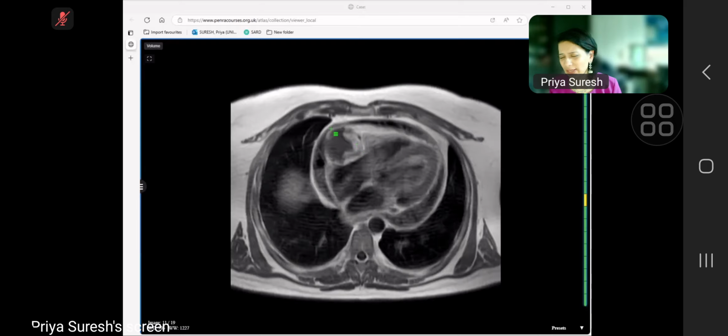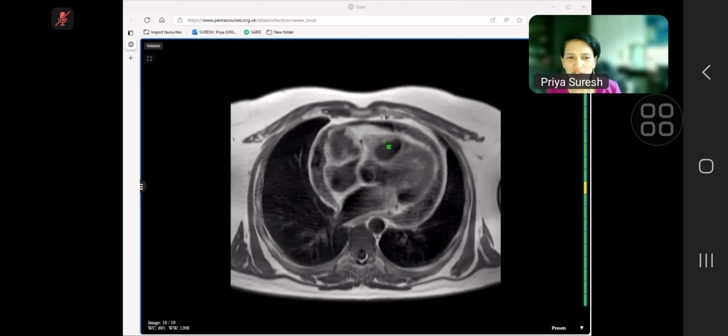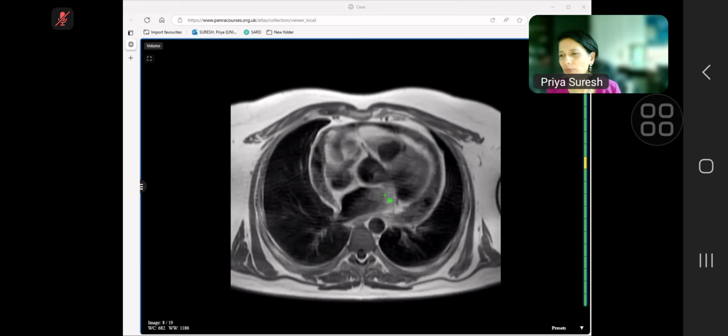So you may not get that, but that's fine. The main thing is to see that there's pericardial effusion, and this is like a necrotic tumor because there's enhancement, and it's a post-contrast scan. So part of it is not enhancing at all. So heterogeneous soft tissue mass, internal necrosis. It's arising from the right atrial appendage, and it was presenting with shortness of breath, heaviness, because of the pericardial effusion, which was malignant pericardial effusion.